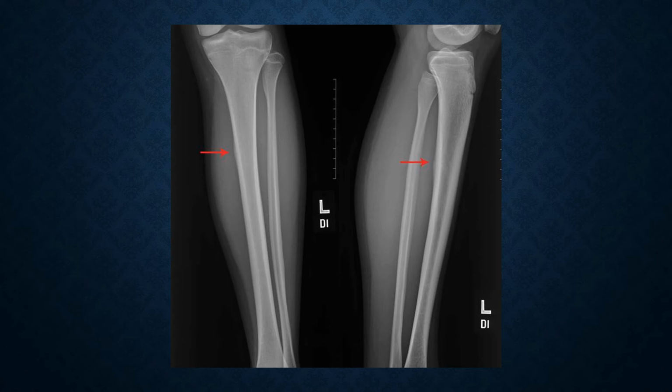Like we've seen in several pathologies in this class, X-ray may not show much until the condition progresses pretty far. This is the case with medial tibial stress syndrome as well. The two red arrows show some evidence of bony stress and cortical reaction.